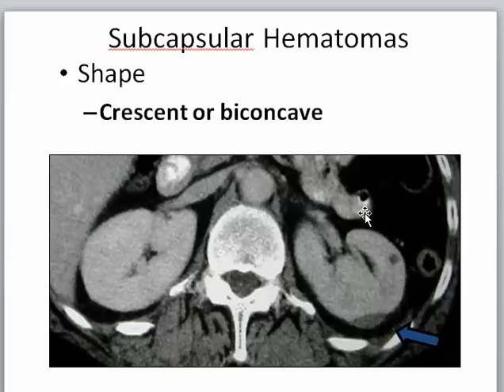If outside the kidney and enclosed in a line here, not going into the peritoneum, this is called Gerota fascia, and if it is not confined to that line and it is just anterior and posterior, it is retroperitoneal pararenal collection. So we have three types of collections. This collection, which is a subcapsular, limited to the confinement of the kidney.